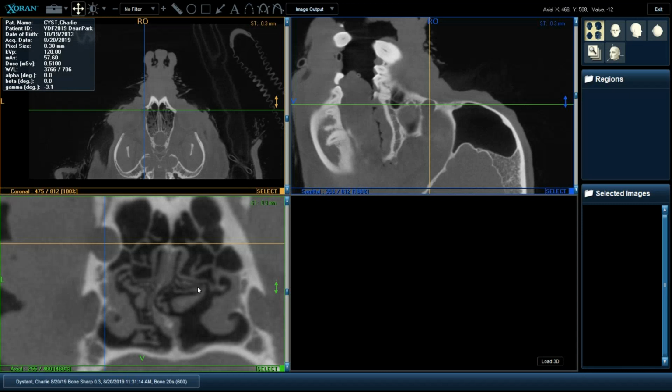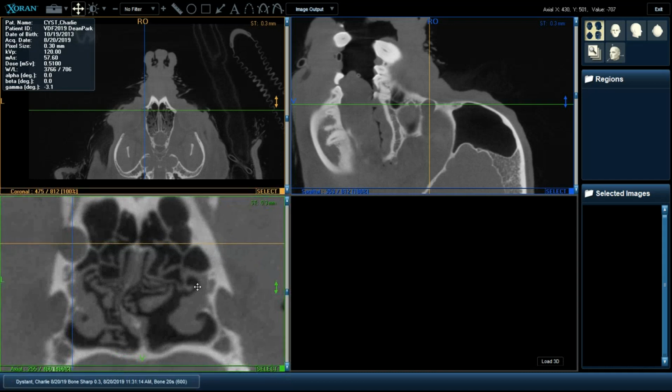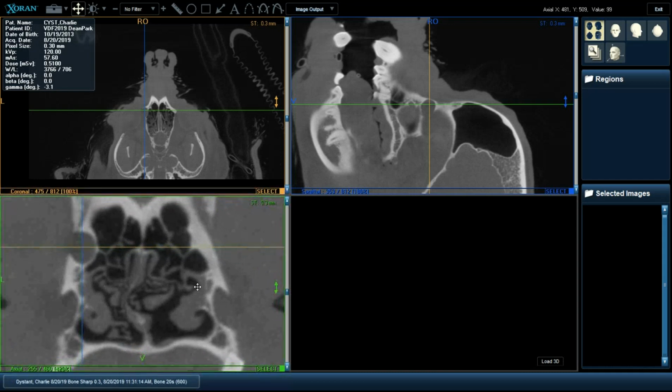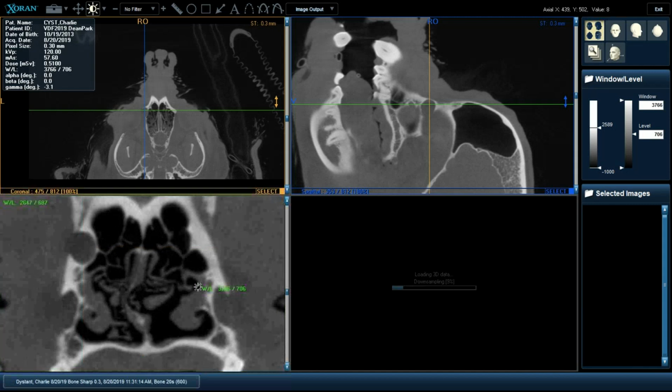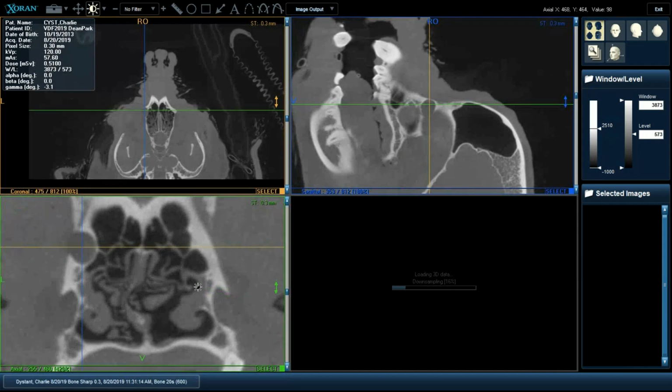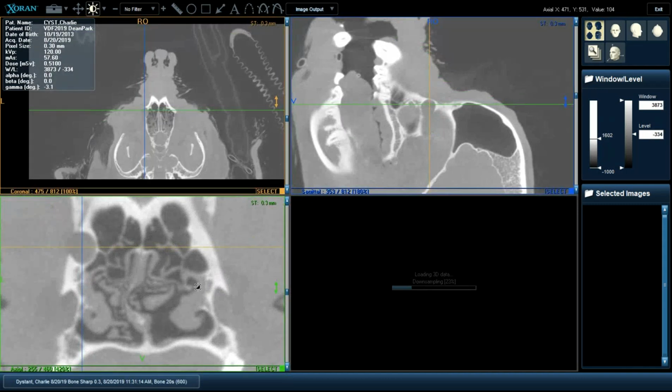Another question here. Sorry, I couldn't see it quickly enough. So it looks like the contrast may not be showing well on your side. We can change the contrast as we wish, and very often it will depend on your screen and your room lights.